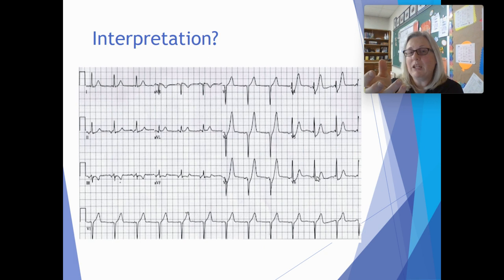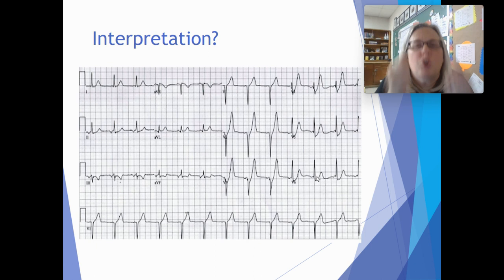Could mean hyperkalemia. We don't really know how old this patient is, so if it's a younger patient in their teens, this might be normal for them. We definitely need a little more information before we can make a full interpretation, and that's one of the first things the ED docs ask me. How old is this patient? I bring them an EKG and I'm like, 25-year-old male, chest pain, shortness of breath. So they know that if they see this early repol or these peak Ts, it's normal for that age group.